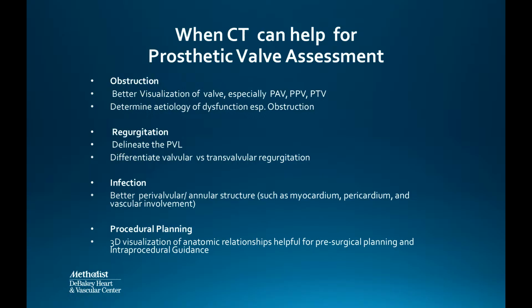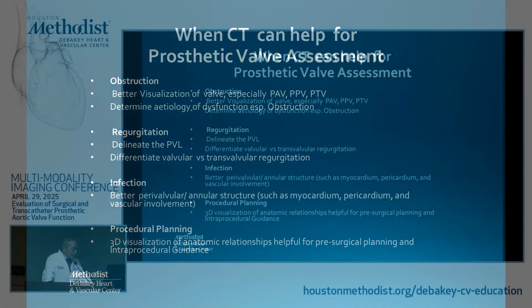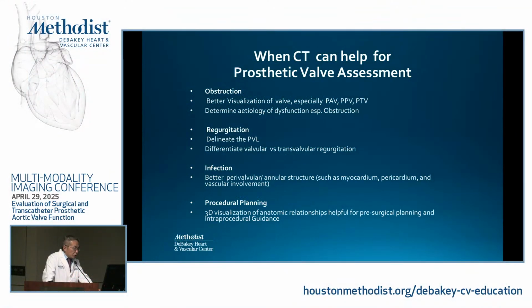Okay, so when can CT help prosthetic valve assessment? I think when you have elevated gradient or suspected obstruction, it is very good, especially for the aortic valve position, and I believe tricuspid valve and pulmonary valve as well. It also can help you determine the etiology of dysfunction, such as pannus, clot, degeneration, or other unexpected findings.